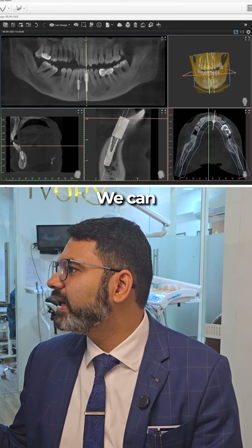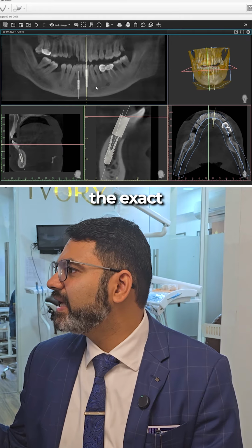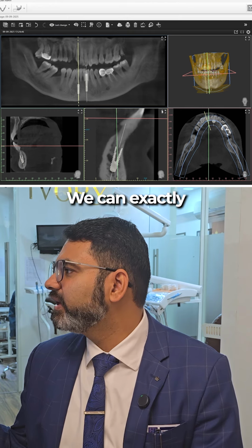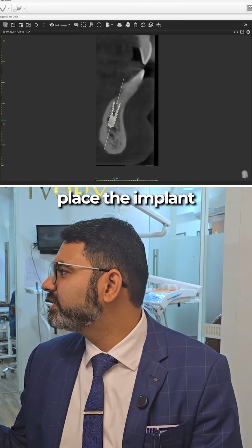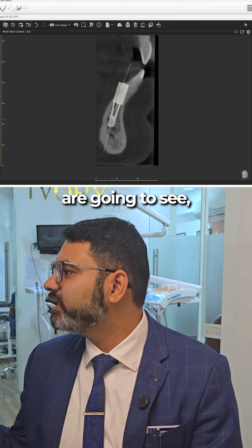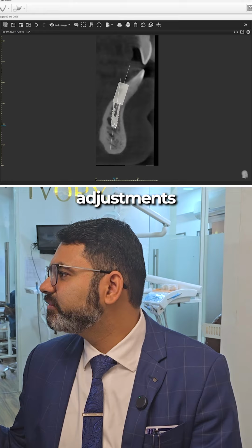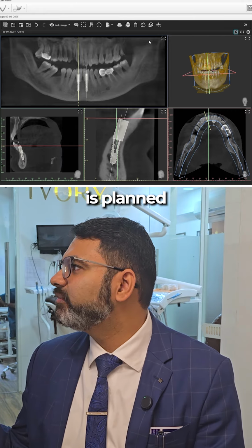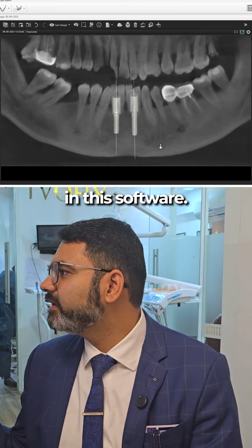All right. We can actually visualize the exact outcome of the surgery even before the surgery has happened. We can exactly visualize how we are going to place the implant, how the surgery will go, any complications which we are going to see, or any kind of adjustments which you want to make in the implant angulations, the size, the fit, everything is planned beautifully in this software.